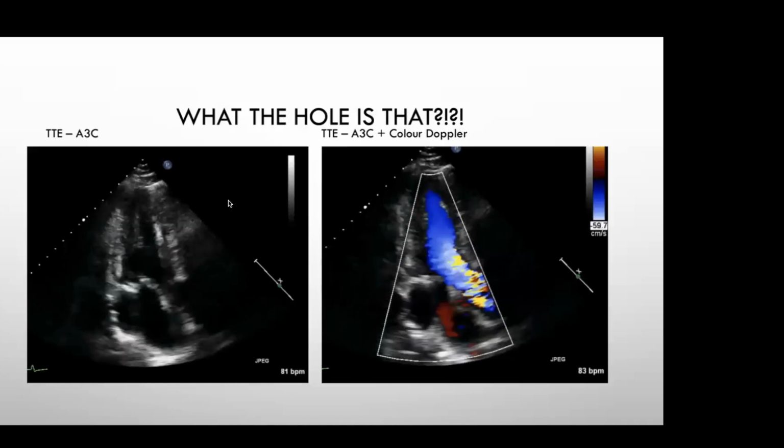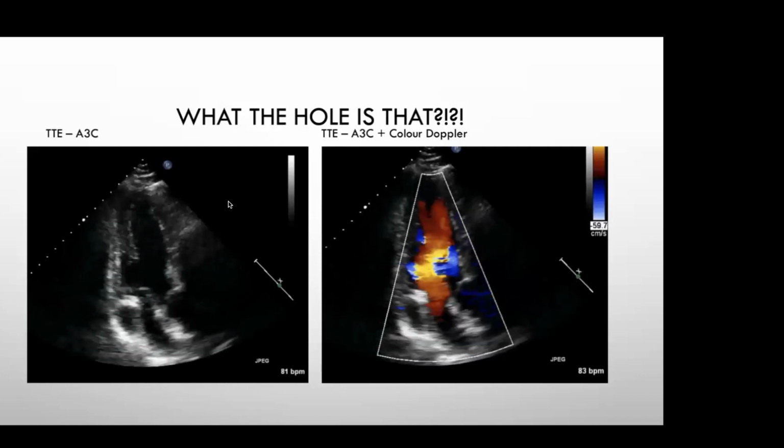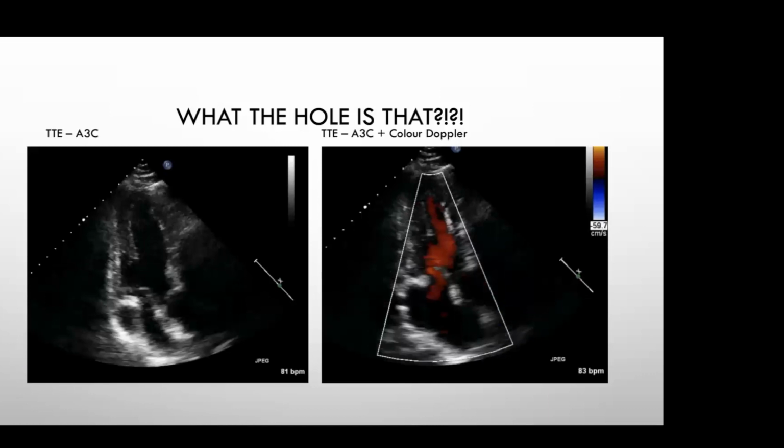Okay, so one more case. Any volunteers just want to say what the most prominent finding is on these images?